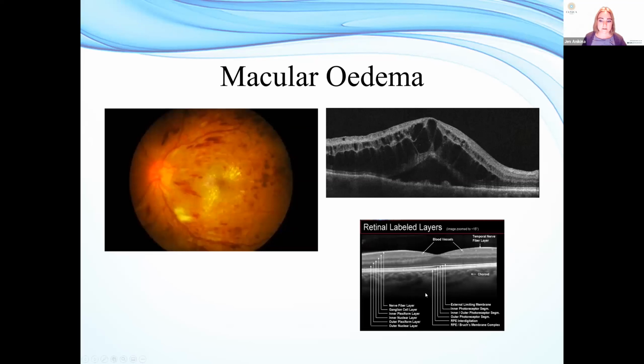We're going to look at this normal OCT scan at the bottom here again. Can you see how that layer I said was important, the photoreceptor layer at the bottom? That here is perturbed. You see all these little bumps. That layer is exactly the layer that things have gotten split at. So that might be a problem.